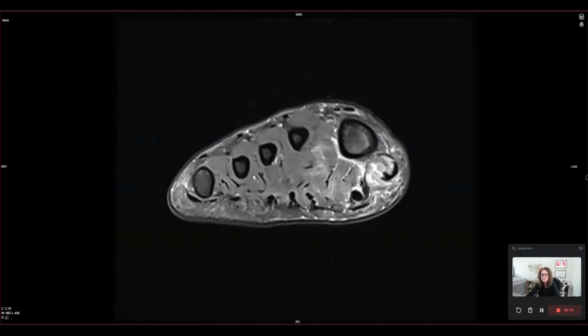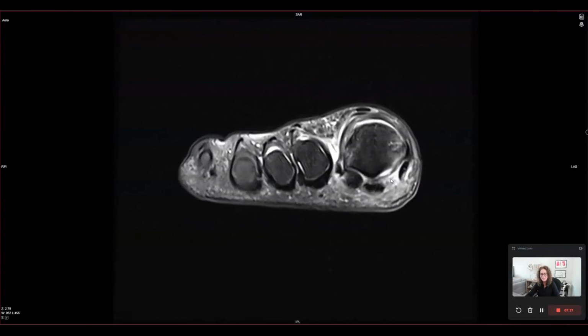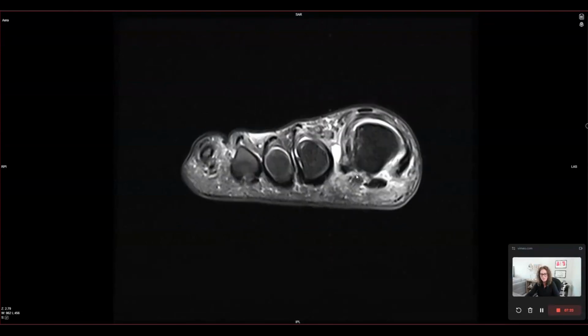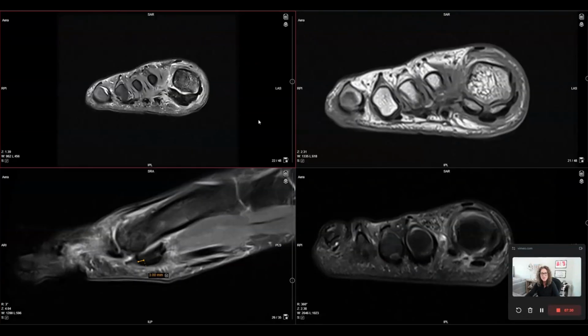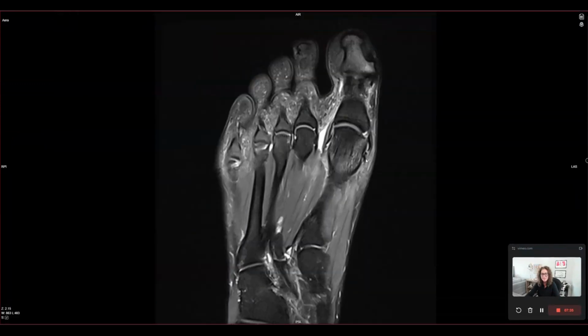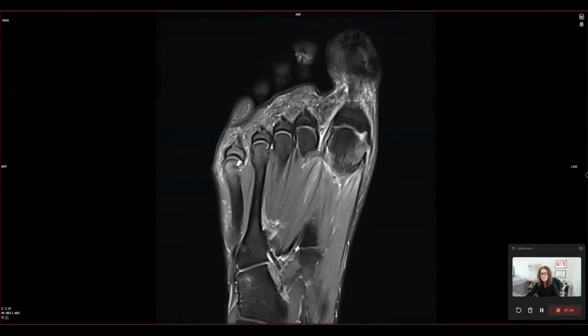So putting the sum total of all the findings together, we can appreciate that there are sesamoidal phalangeal ligament tears, both medial and lateral, a tear of the plantar plate itself. We have a partial tear of the tibial collateral ligament at its proximal attachment, seen here. The sprain of the lateral collateral ligament complex. We have intermetatarsal bursitis seen here.